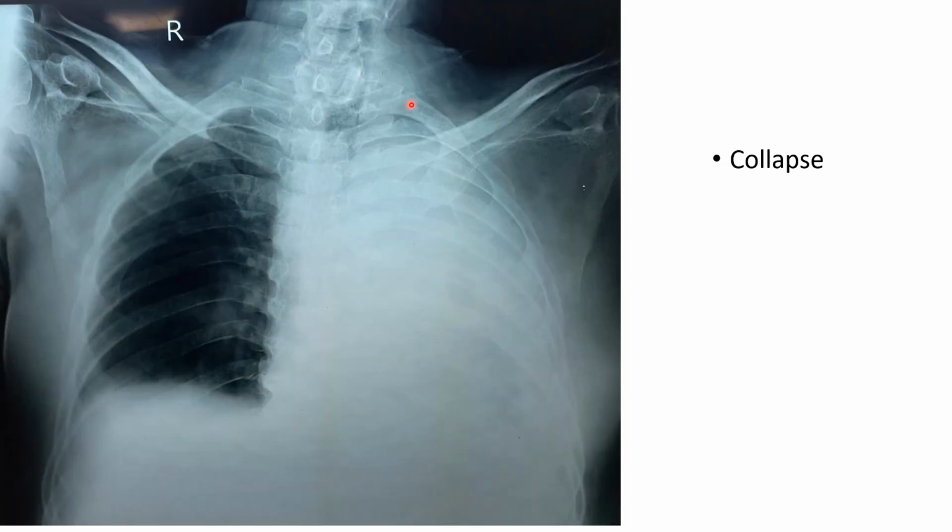Here there is a complete whiteout of the left lung. Now look at the trachea. This trachea is slightly shifted to the left side. And if you see the opposite lung, normally the cardiac shadow will come somewhere up here, crossing the midline and spine. But here you see the lung has reached the spinal area, so the cardiac shadow has been shifted up here, right?